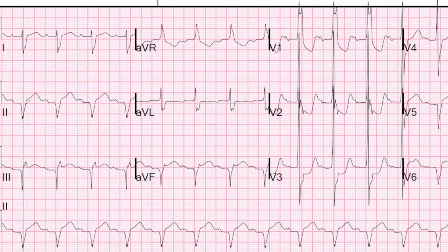In atrium and AVs, in atrium, we first found P mitrale. Next one, first degree AV block. Next, the QRS. Width of the QRS. How wide is the QRS? It's wide, meaning that there's some kind of block from the ventricles, like the signal isn't conducted properly, they're not contracting. So we do have an intraventricular conduction block. Which one?